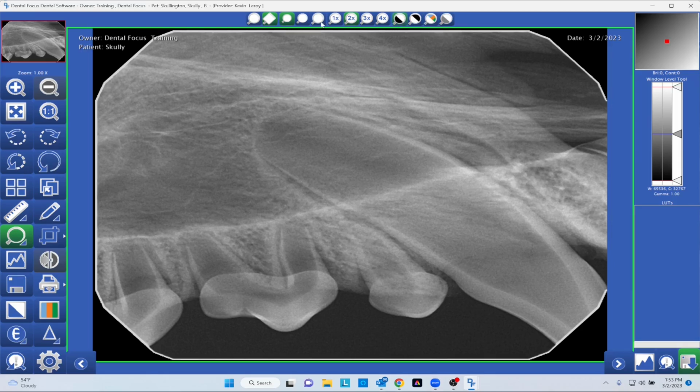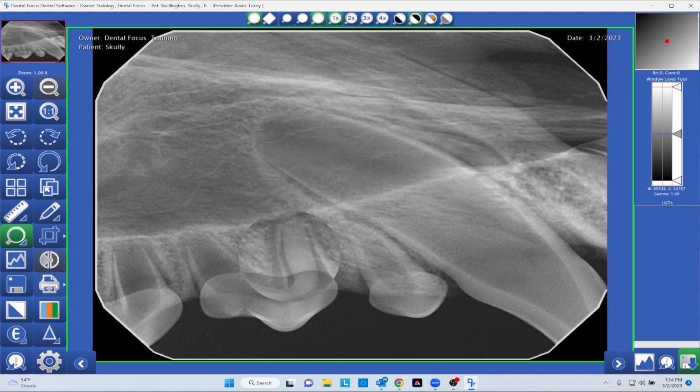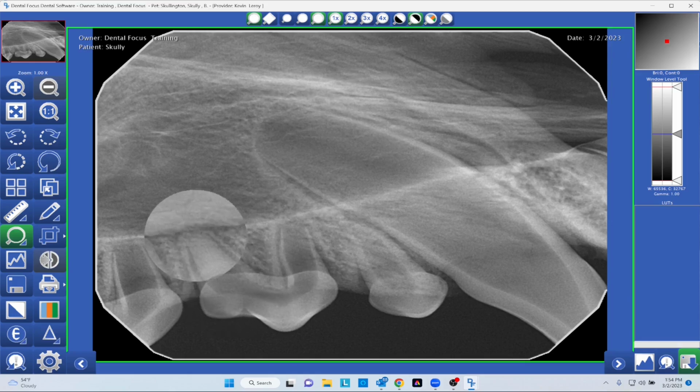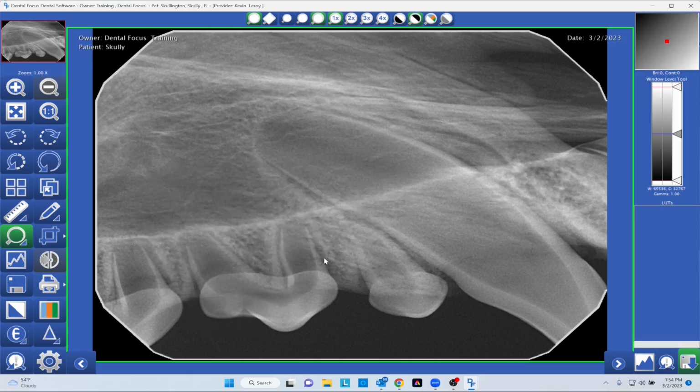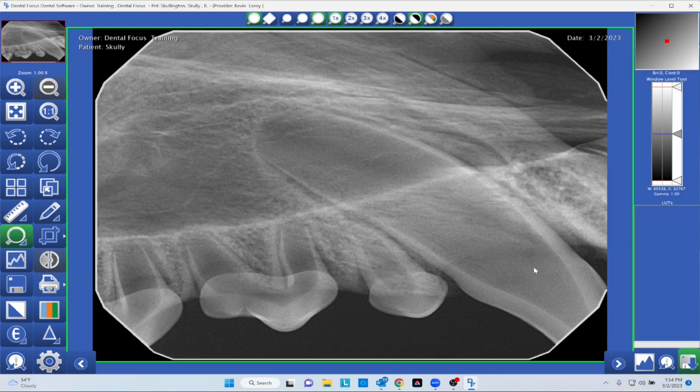So a high contrast effect will give you a different look. So here is a high contrast feature in the spotlight. Here is our negate feature in the spotlight, where we've changed everything that was dark to light and light to dark. This is a wonderful way of tracing down the periodontal ligament spaces. They really highlight out white, and especially in a case like this where we have a very young dog, we can see where his apex will be when he closes off.